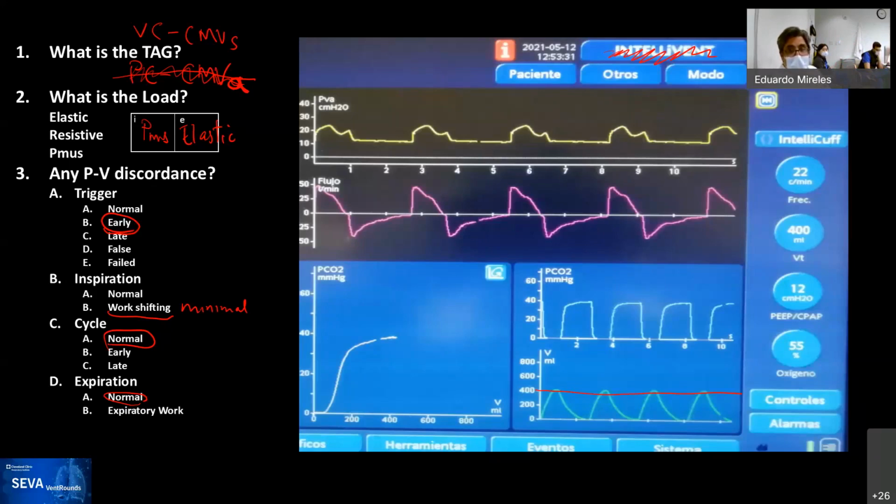Very good. Any other comments that came out on the chat, Rob? Yeah, Ariel made the comment that no ventilator is a perfect flow or pressure controller, and he would consider this to be a reasonable flow waveform, even though there's a slight amount of distortion. Well, I would counter that, from the images we have seen in the lab, the ventilator controls the flow very well. I don't know what you think about that versus the pressure.